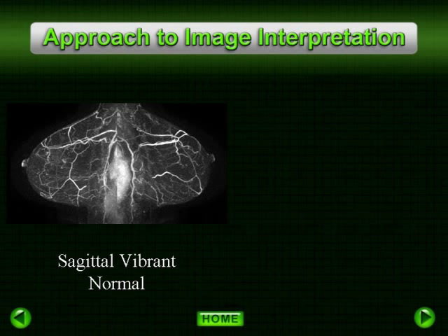Here, demonstrating a sagittal parallel imaging protocol, you can again see with the 1-minute subtraction MIPs symmetric vascular enhancement with minimal background parenchymal enhancement. There is no significant asymmetric focal or regional enhancement. A small area of enhancement centrally in the right breast was ultimately shown to represent a small intramammary lymph node.